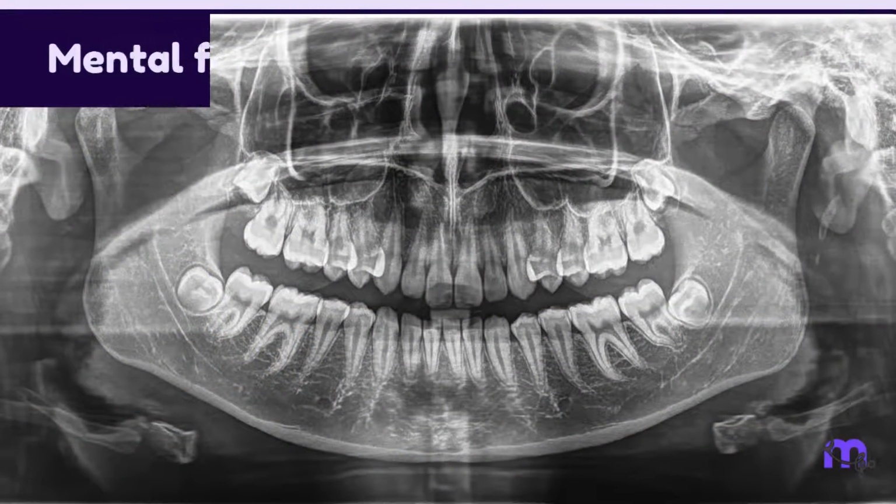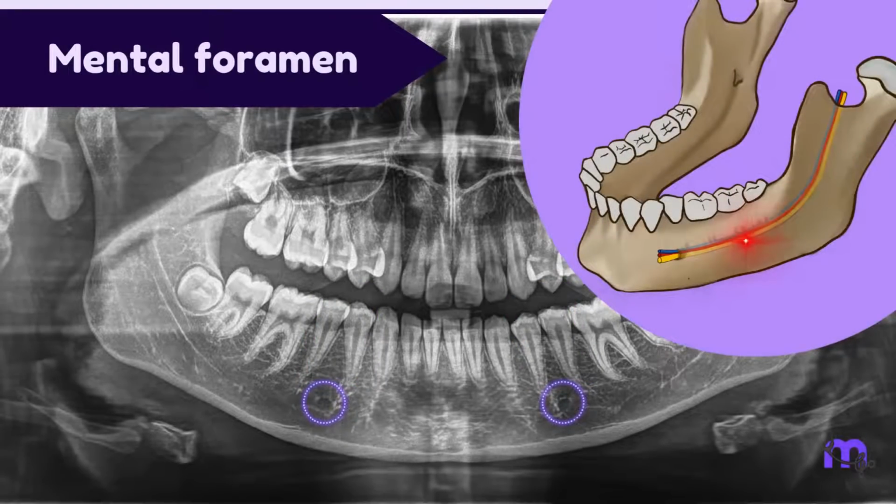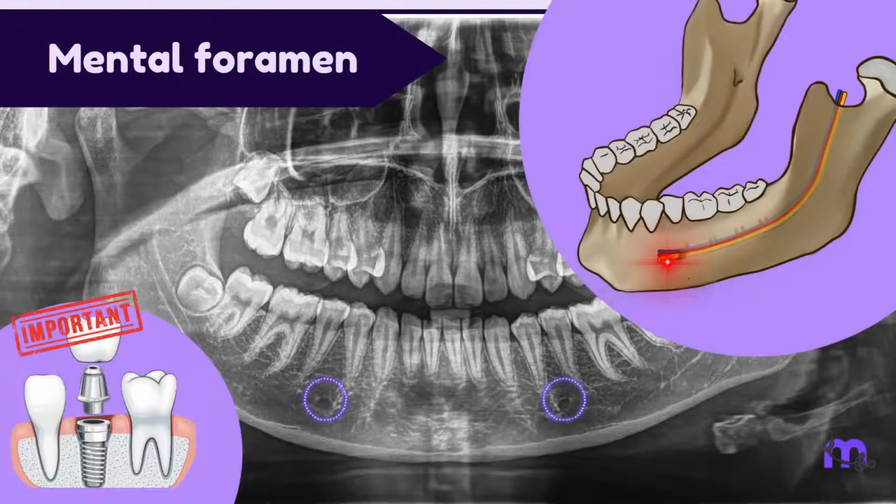Moving to the mental foramen, it is a small ovoid or round radiolucency located in the apical region of the mandibular premolars. It serves as the exit point for the mental nerve and is an important landmark in dental procedures such as implant placement in the mandibular arch.